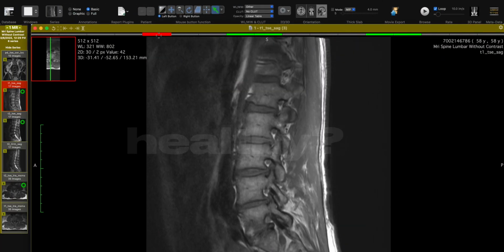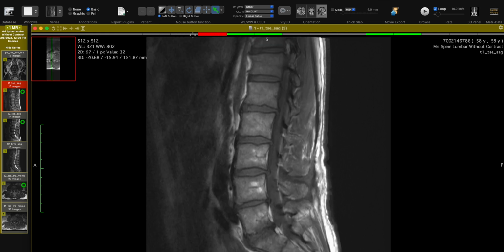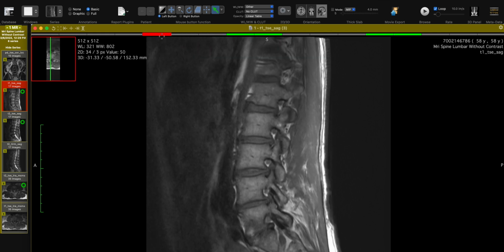But honestly, this is a pretty healthy back. Doesn't look like it, right? But for a 60-year-old, this is pretty healthy. His disc height is pretty good. I'm not a radiologist. I do not look at MRIs for a living. I look at them to look at structure. So do not listen to me when I'm saying that this doesn't look that bad. It could look terrible. For my eyes, it doesn't look terrible. But I'm pretty aggressive when I treat these types of cases.